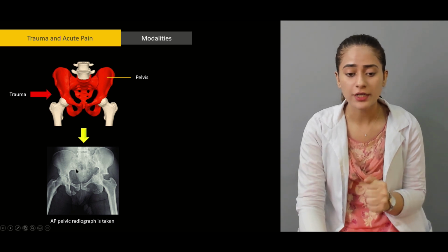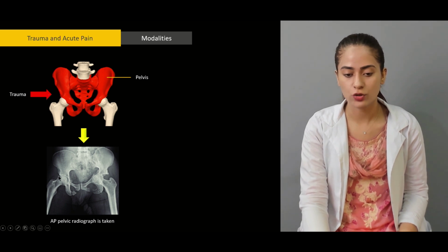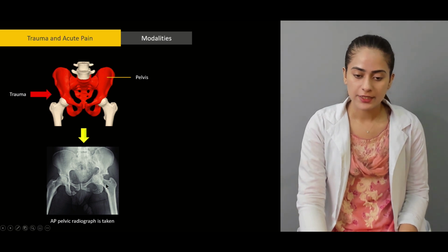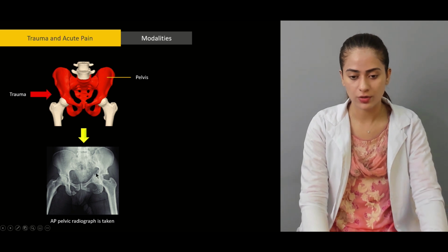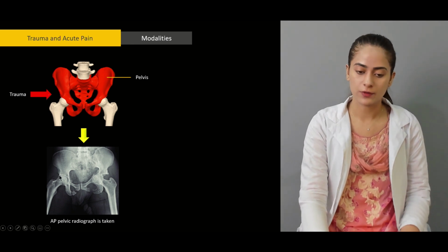So here again, let's label it. This is ilium, ischium, and then pubis, which is forming this acetabulum here, and then this is the femur. On the left side, the left femur is displaced. It is pushing into the acetabulum. The acetabulum is not anatomically congruent anymore, so it's disrupted here. This entire fragment has become dislodged. This fragment has been dislodged. There's a fracture here, and this seems normal. The right femur is normal.